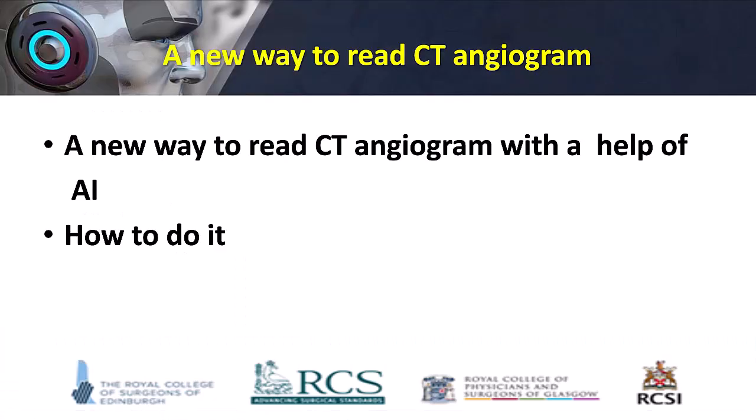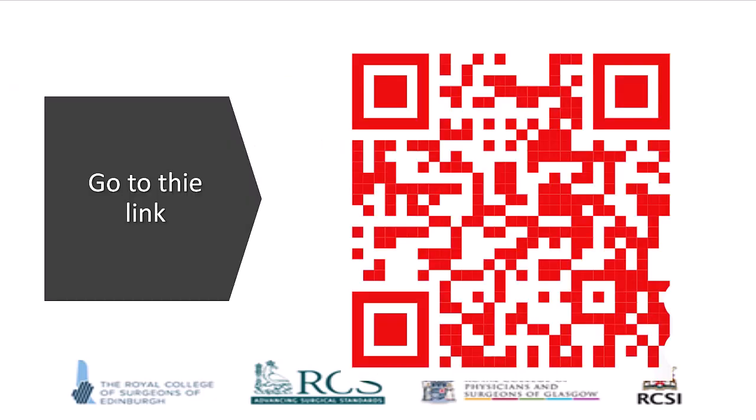So the lesson today is a new way to read and study CT angiogram. And this is an extremely useful tool. Now let us see how we can do it. Very easy. With your mobile phone, you just go to this QR code. And when you go to this QR code, here I will show you how you can deal with it and how to get information.